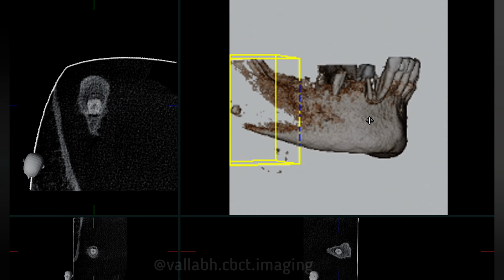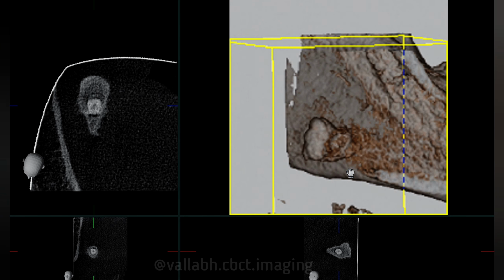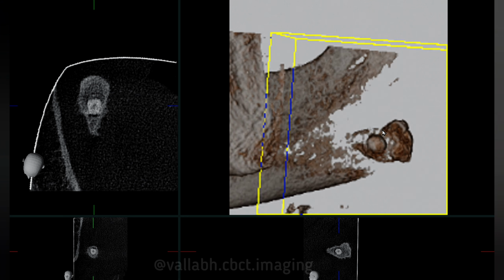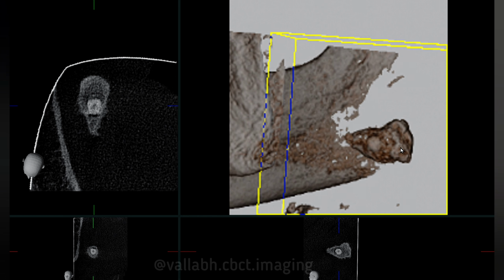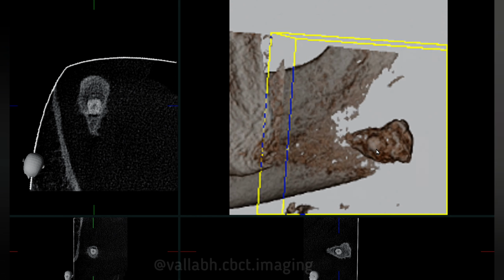This is seen from the side profile view. There is a tooth-like mass seen from the side profile view, along with the tooth and the salivary gland stone radio opacity. Now we'll see it from the inner aspect, how it is seen from the inner aspect. This is how it is seen. This is the salivary gland stone from the lingual point of view, and we'll reduce this, and you can see the radio opacity over here, which is a tooth-like mass.